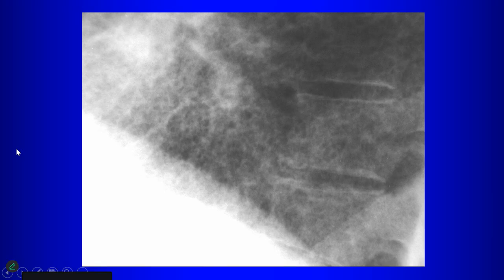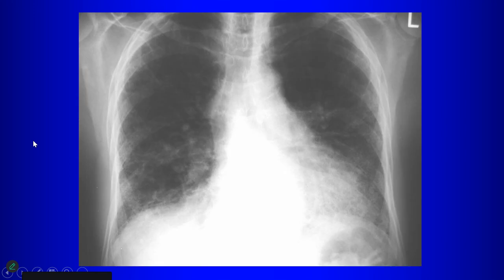If you're not sure from the frontal view, if you're dealing with interstitial lung disease, look in the retrocardiac region on the lateral view. That should be a relatively clear area. If you look very closely and you see lots of reticular opacities there, that's abnormal. And that will increase your confidence that, okay, we're dealing with some kind of interstitial disease here. We should get a CT on this patient to categorize it and see what's going on.